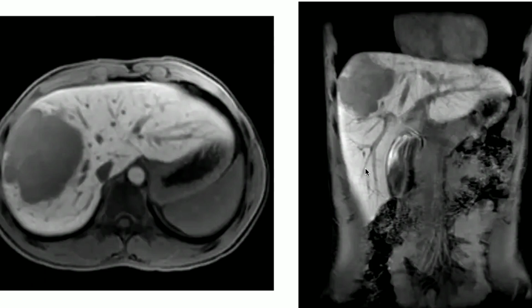The other hint is to look for contrast within the collecting system, within the biliary system. Because if it's taken up by hepatocytes, then eventually it will be excreted into the biliary system, and we will see it in the bile duct and in the gallbladder. So, and yes, if the lesion is FNH, it should?